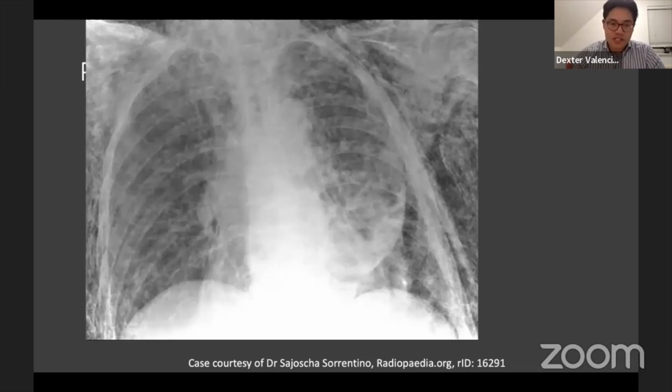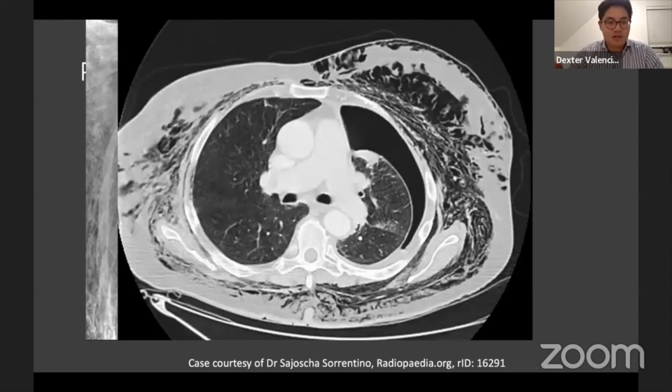Pneumothorax. So this is a chest x-ray, which is very abnormal. There is a pneumothorax on here, on the left, so this is where the pneumothorax is. You can see that sharp line there, but the other abnormality is that there are lots of dark linear lucencies throughout the chest wall. So this is surgical or subcutaneous emphysema, and this is what it looks like on the CT scan.